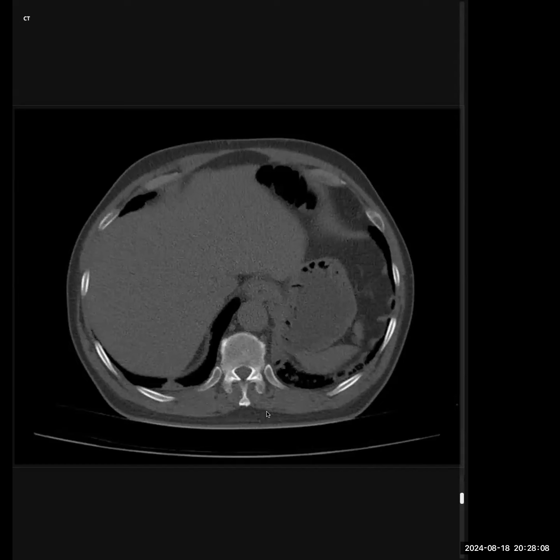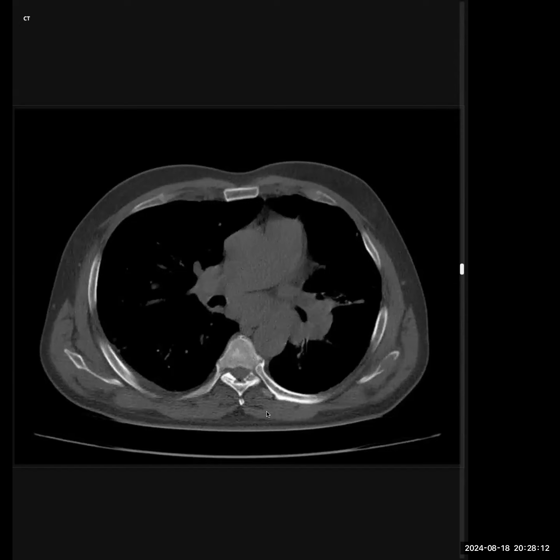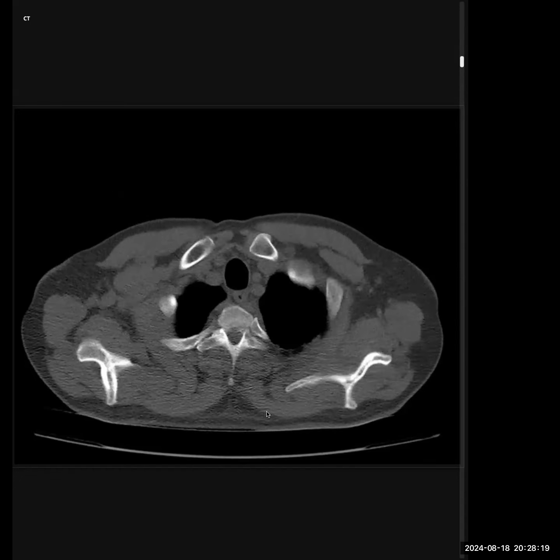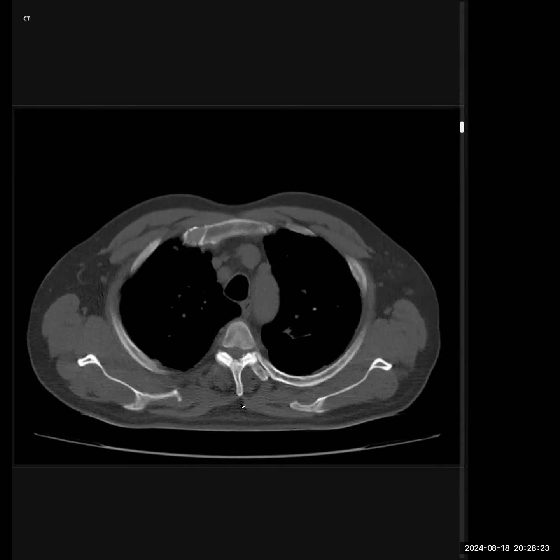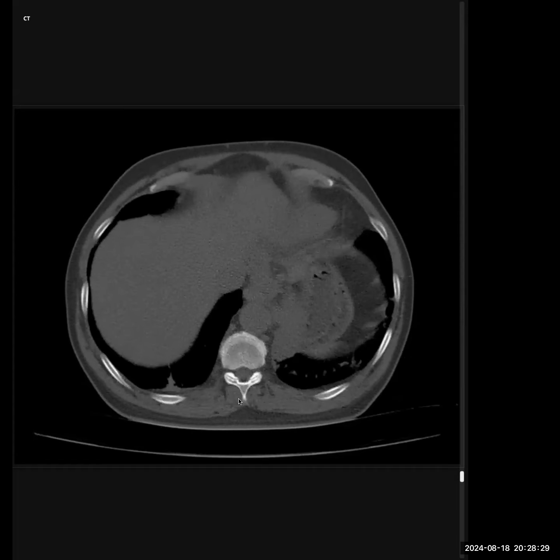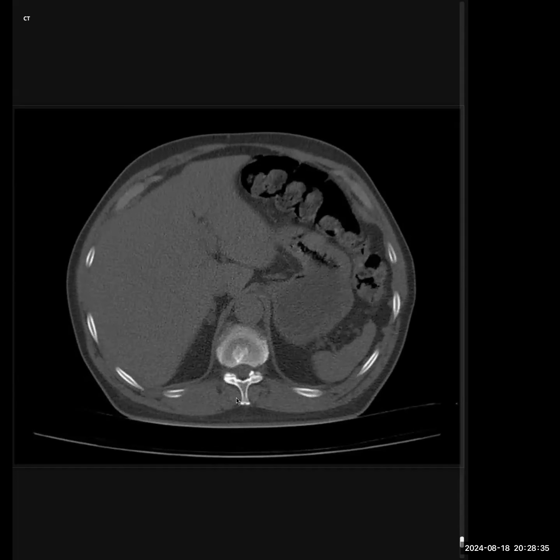So this confirms my suspicion of a primary lung carcinoma with probably metastatic nodules within bilateral lungs and the possibility of bony metastasis. I would convey these findings to the referring clinician and order for this patient to be sent to the lung cancer MDT discussion. The patient would also require a completion CT of the abdomen and pelvis for staging purposes.